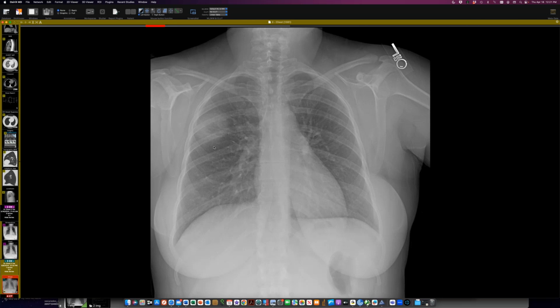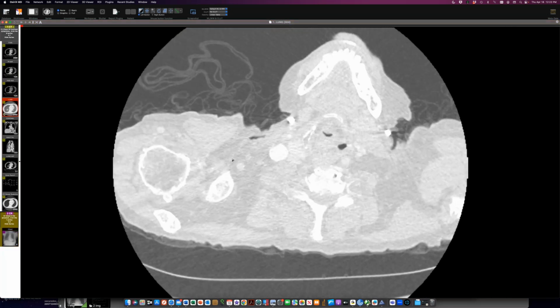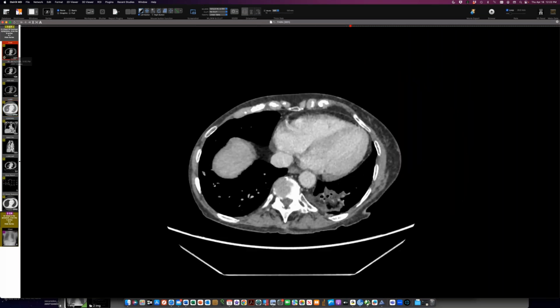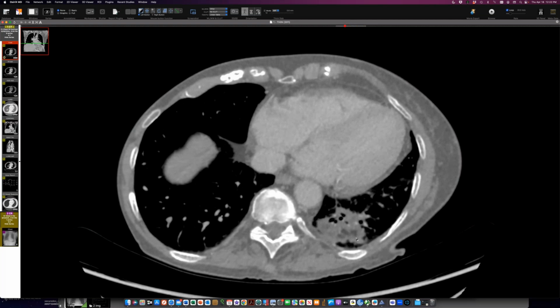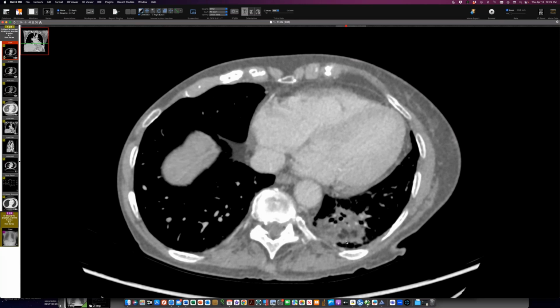So let me show you one other case that's more straightforward. There's a faint lower lobe consolidation behind the heart here, and this has a distinctive finding on CT. So here's our lesion on CT, and it does have this low attenuation component to it. So let me show you that. There is a fat containing lesion down here, and this person does use mineral oil regularly as a laxative. So this is a mineral oil aspiration with nice lipid deposits here matching the density of the subcutaneous fat here. So this is exogenous lipoid pneumonia down here.